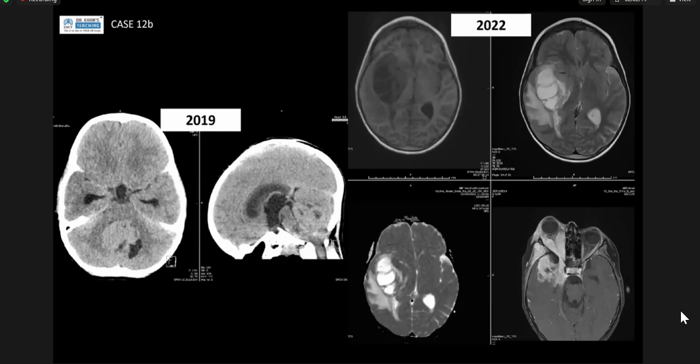I see a lesion of the orbit, cavernous sinus. I see a lesion in the intraparenchymal basal ganglia too, and medulloblastoma, germinoma, and NF, tuberculosis. Do you think that the lesion in the brain looks aggressive? How does that link to the lesion in the bone? If it were an adult, what would you be thinking?